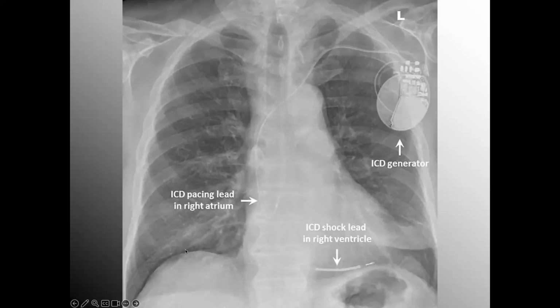D for diaphragm, right is elevated above the left. They both have kind of a dome shape to them. I do not see the sulcus, but I assume it's not blunted beyond this point. And on the left side, I can see it's quite sharp.